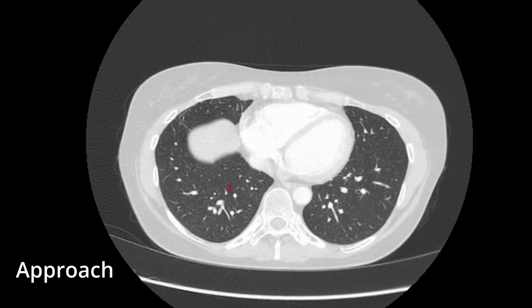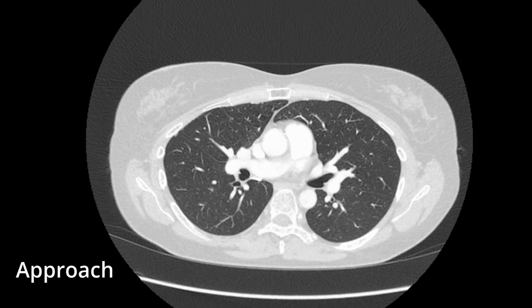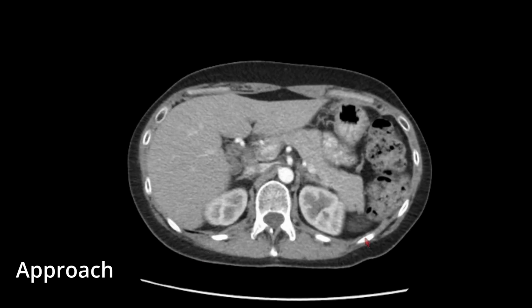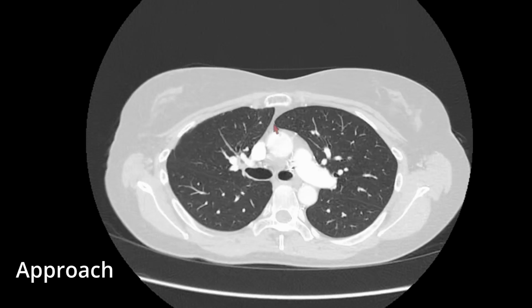After characterizing any opacity or lung nodules, we look for pleural effusion and any pleural abnormality. Soft tissue windows are good for that. We see if there's any pleural thickening or any pleural fluid. We look for any free air, which is better seen on lung windows.